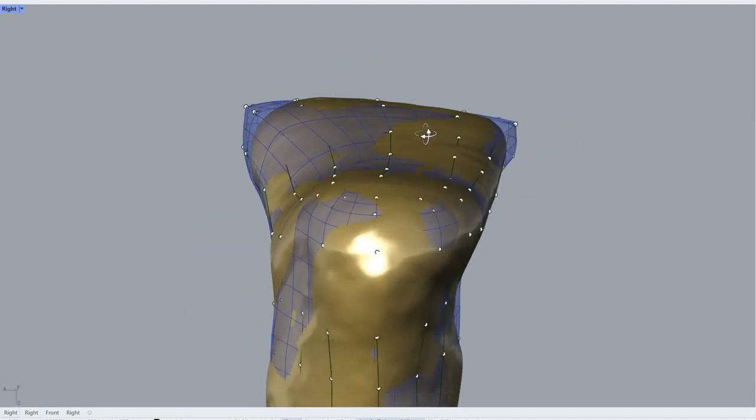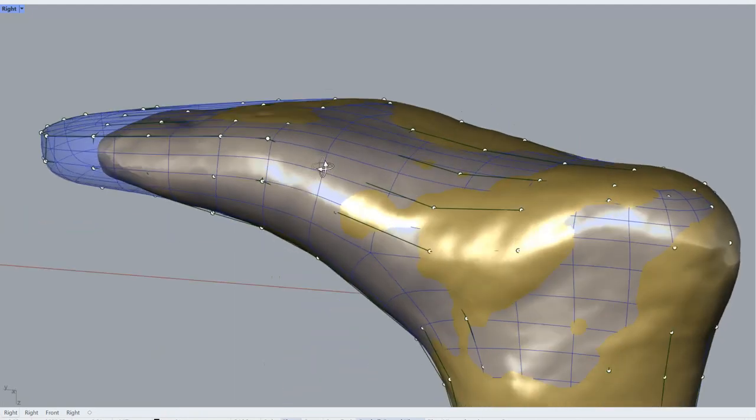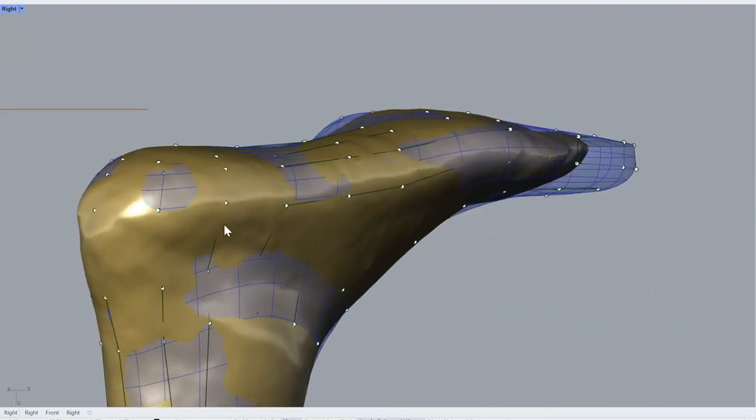Sometimes it's just half a millimeter or something, so sometimes you want extra space, sometimes you want less space. Another thing is that this cast is quite rough and I want a smooth surface, so at certain places the last will go inside the scan and other places it will go outside the scan, and how much and where, and the accuracy and all those kinds of things, well, it's a question of trial and error.